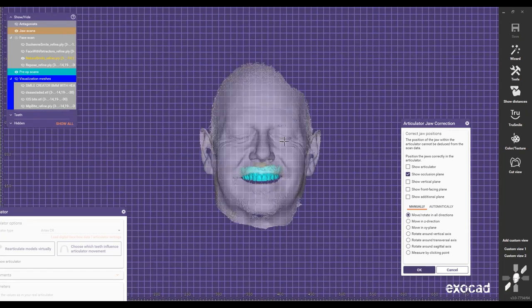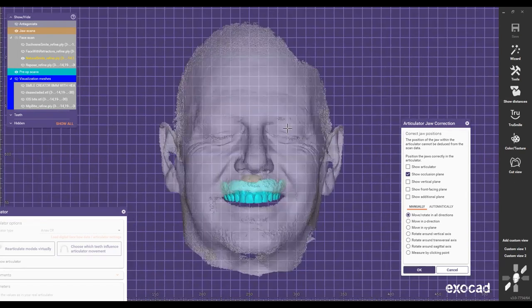So what we do is, even if we have the eyes open, we're not going to be able to see the pupils of the eyes, because it's going to get distorted, it's like watery there, right? So the scanner won't be able to pick it up. Even if I try to scan the eye with an intraoral scanner, it's not going to scan that. So we just have the patient close the eyes, and we're going to use the inner canthus of the patient's eyes, and that's how we're going to put him straight. We're going to use the background lines, and we're going to straighten that face accordingly.